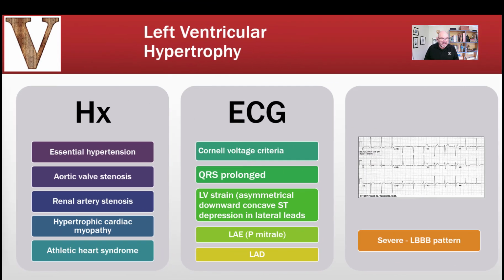The clinical correlation is that left ventricular hypertrophy presents with respiratory symptoms, normally secondary to pulmonary edema and a reduction in cardiac output. Positive ECGs might confirm that left ventricular hypertrophy is a contributing factor, or it can help identify risks when you're assessing patients with non-acute presentations and trying to make determinations as to whether they're safe to leave at home or what degree of follow-up is going to be required.